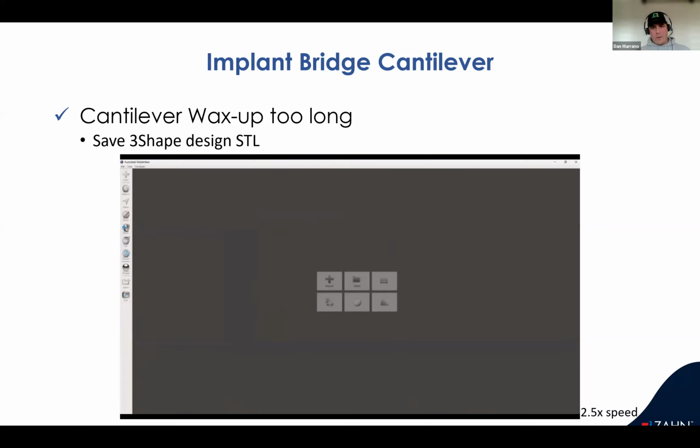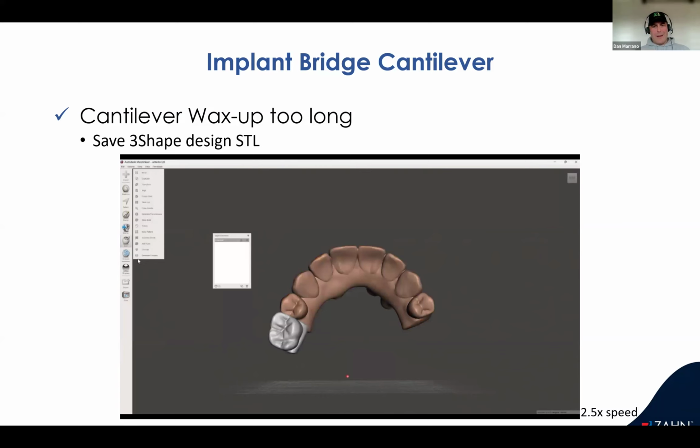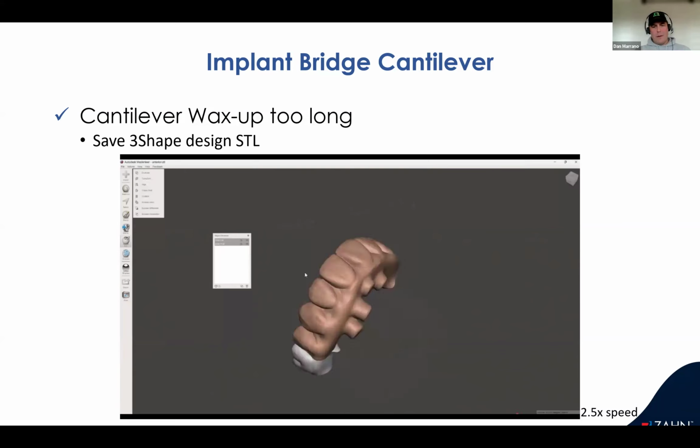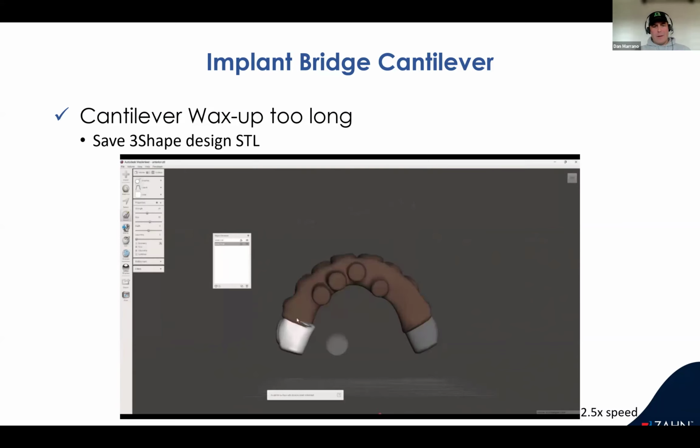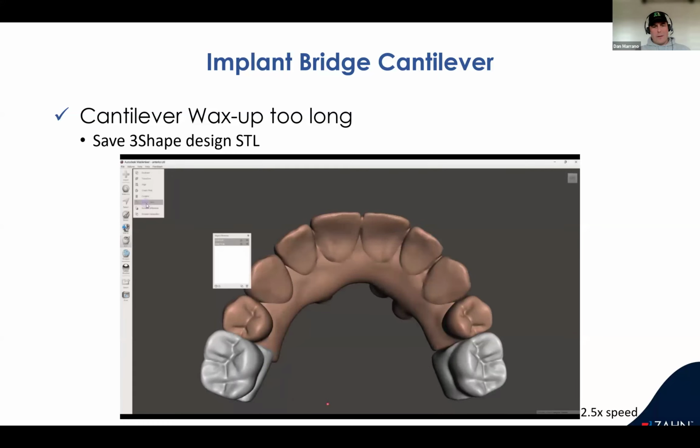We do go to Mesh Mixer. And I'm going to put these 3 pieces together in Mesh Mixer to make one. You can't just save them as one. A wax up copy won't take that. So you do the Boolean union. This one gave me a little bit of trouble. Instead of going back, I did notice that it was just a little bit of smoothing. Just cleaned up the edge on that thing. It accepted it.